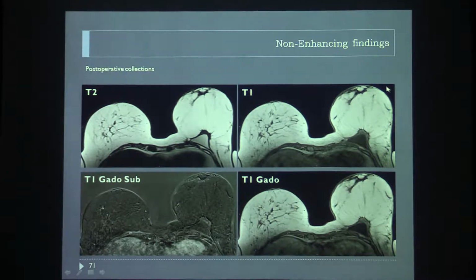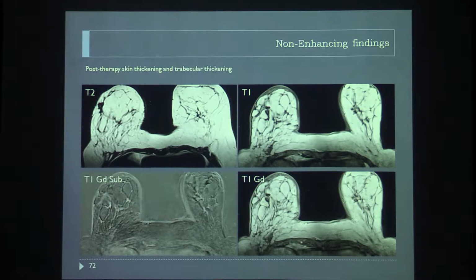Actually there is a reconstruction by a DIEP flap in this patient, and it's not uncommon to have a seroma in breast reconstruction. Like here, watch out for that. It's common to have that. We just have to make sure there is no enhancement within the spiculated lesion. This is just scar. If there is an enhancement, you have to perform a biopsy, of course.